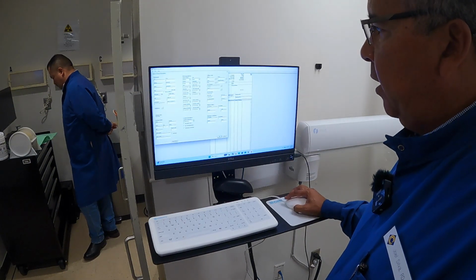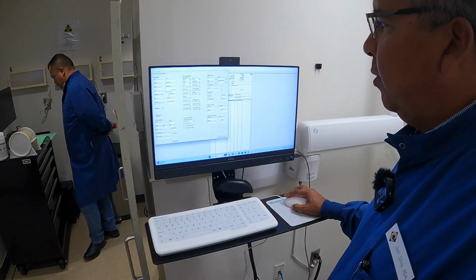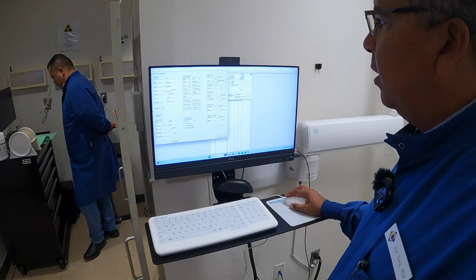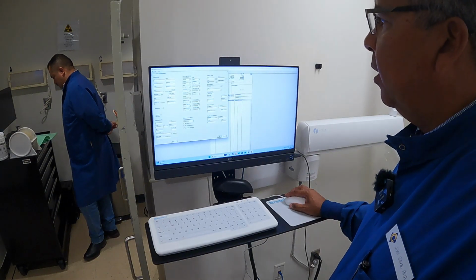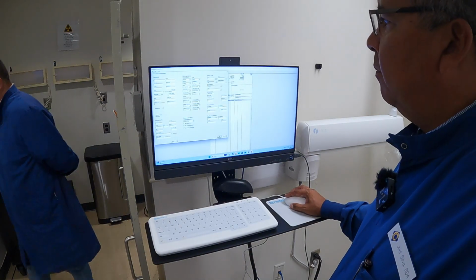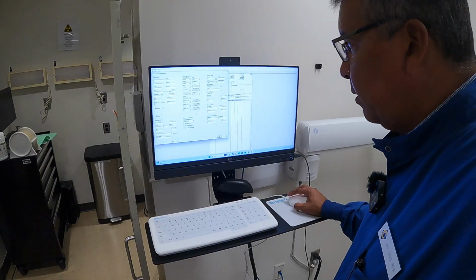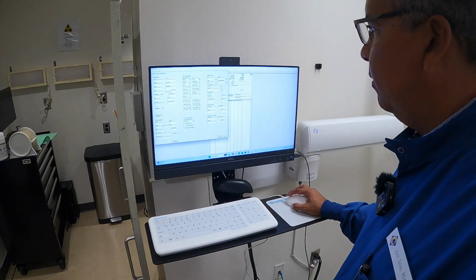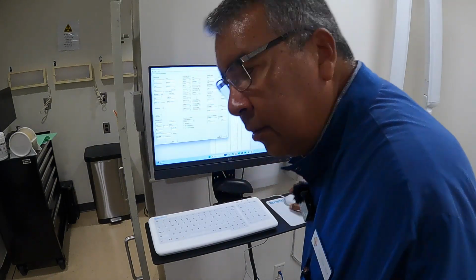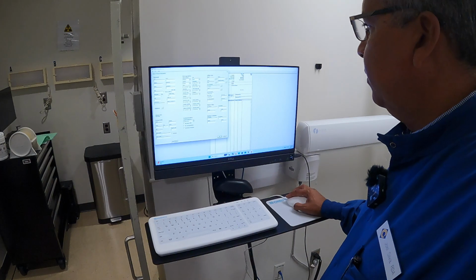We okay here and here? Okay. Then the demographics. You don't have to put in anything that you really don't want to on there, although at the very least you're going to probably want to put on just your sex, marital information, and that's pretty much it. And if you want to do a deep dive and do all these, you're more than welcome to. It's fine, especially if you're a veteran. Any veterans in here? No? Okay. Don't need to do anything with communication.